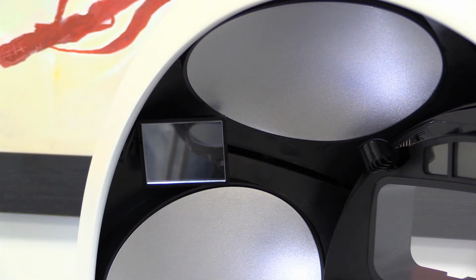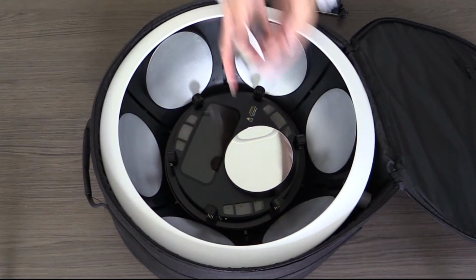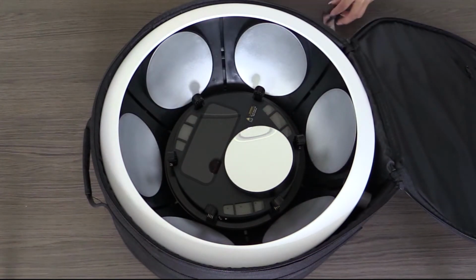If you have trouble installing the mirrors, alternatively you can place the barrel of the OBSERV 520 on a flat surface and install it in the same way as just explained. If you choose to do it this way, we recommend to use the travel bag of the OBSERV as underlay to avoid damaging the front of the device.